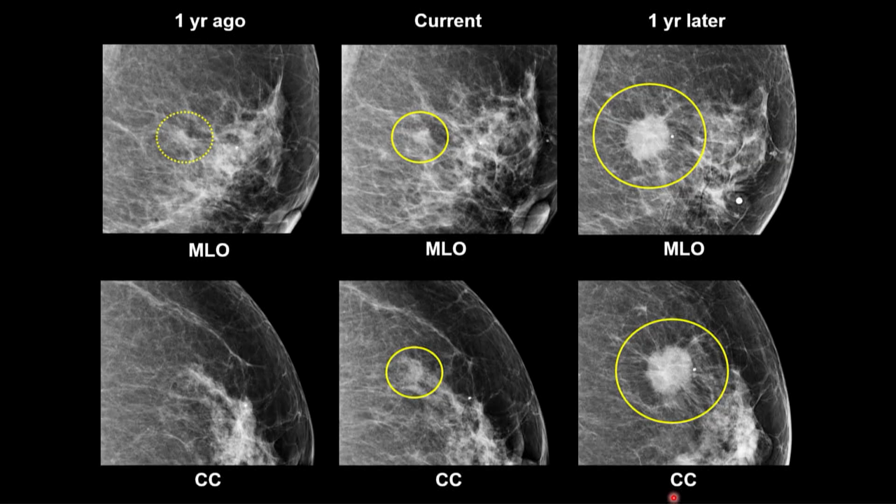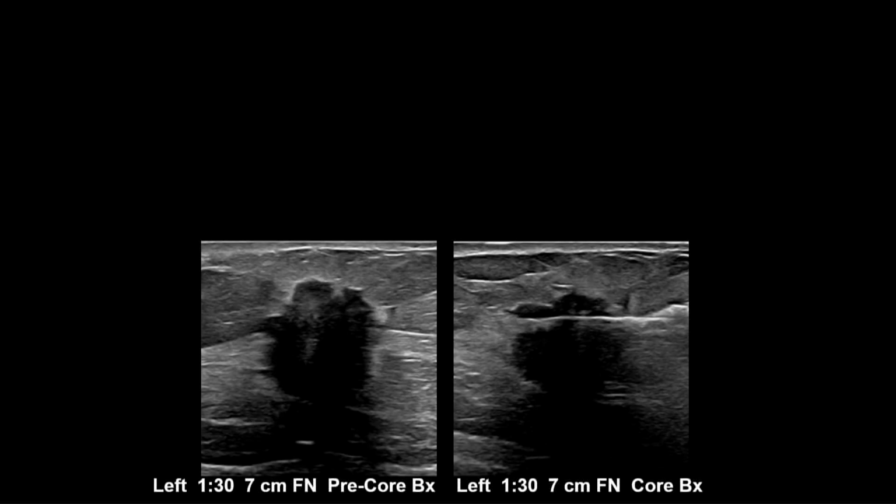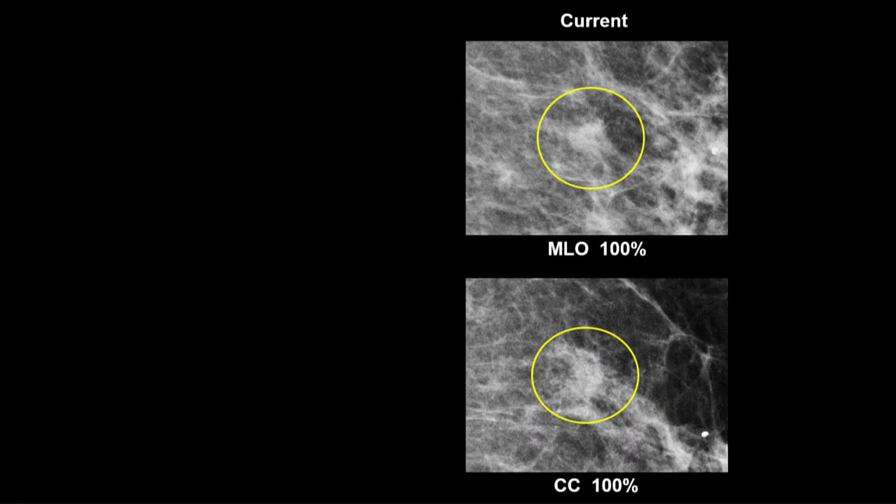Now, I show you this case for the medical legal reasons and also to show you that we're not perfect either. So don't expect anybody to be perfect. It didn't change much here, but this is only a year and it had a big difference. So you think that we're going to get sued over this one? Well, the answer is we're not going to get sued over this one. And the reason, even though it's big and obvious, remember her history.